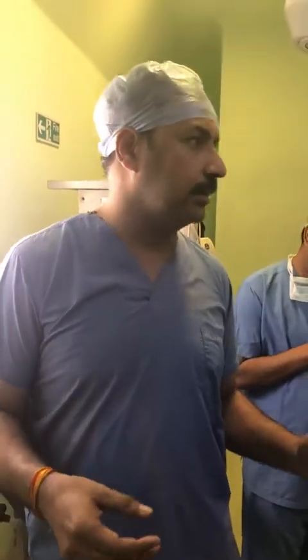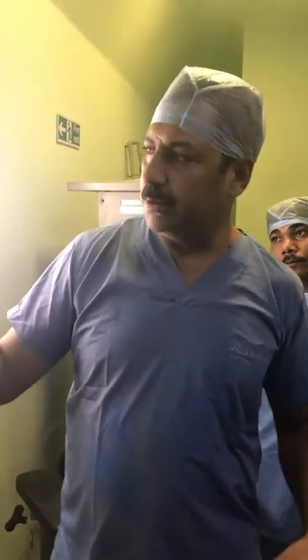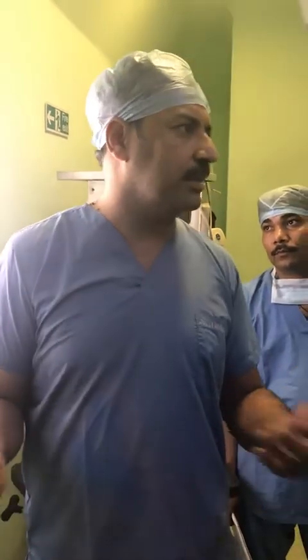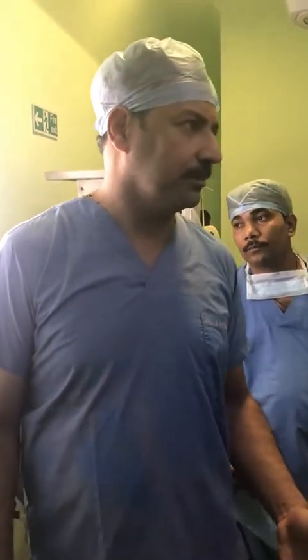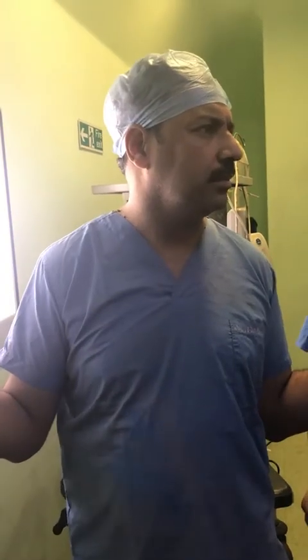He consulted many places. Somebody was treating on the line of malignancy, took multiple biopsies also, which turned out to be negative. Somebody was treating on the line of malignant otitis. Yes, this is a differential diagnosis. This is a difficult situation. It's always difficult to differentiate between a malignant otitis and a nasopharyngeal malignancy with these extensions. Get a diffusion weighted MRI. This will differentiate one and all.